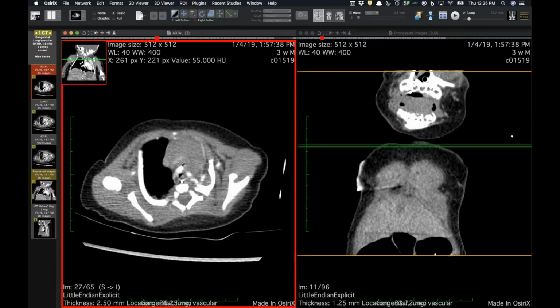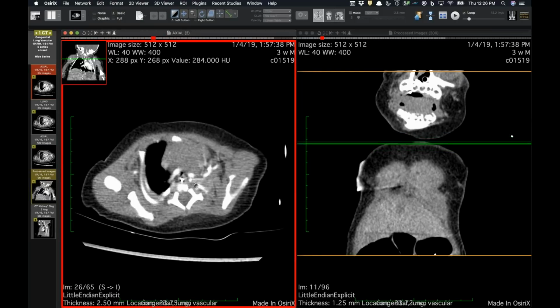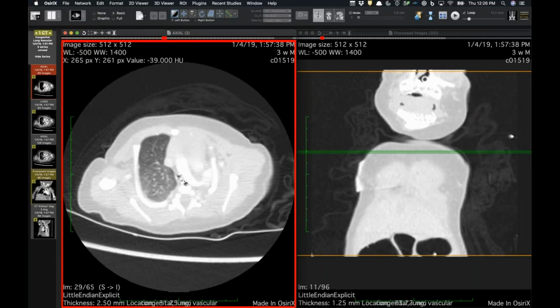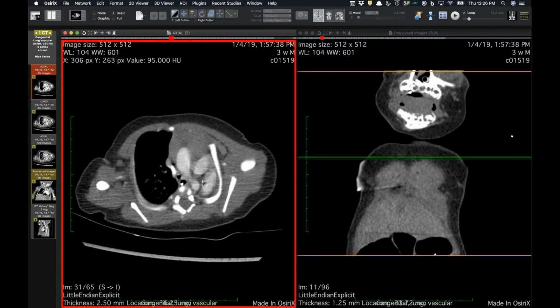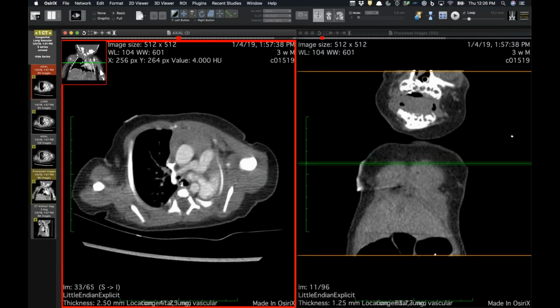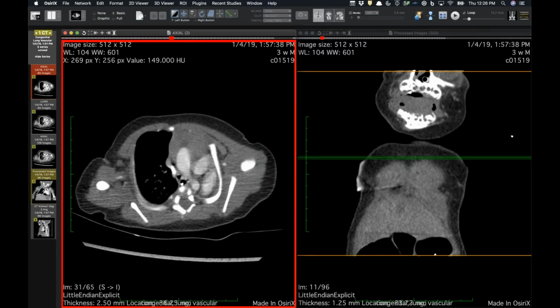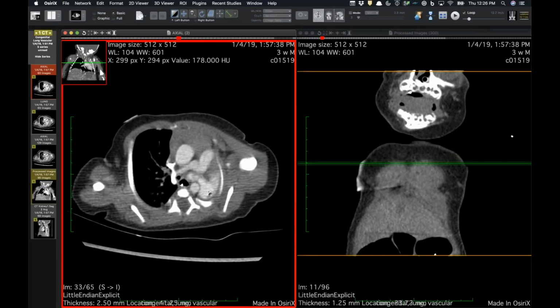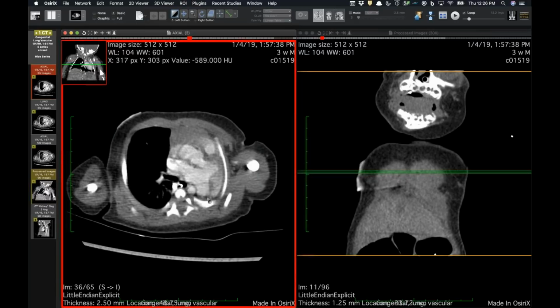And they tried to bronch him to see what his airway and anatomy was. You can see that his extrathoracic trachea is normal caliber, and his intrathoracic trachea is tiny. It's 1 to 2 millimeters. So I'm guessing he probably has complete cartilaginous rings. That's at least my thought here, just given that he's got a lot of other abnormalities that you'll see. When you quickly scroll through, there's a lot of volume loss on the left side and shift of the mediastinum.